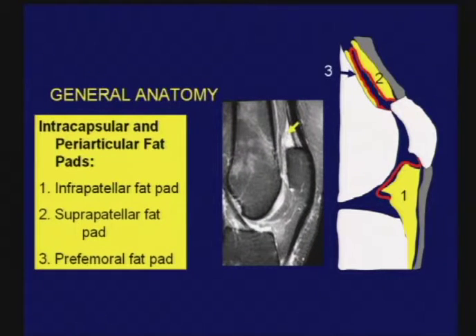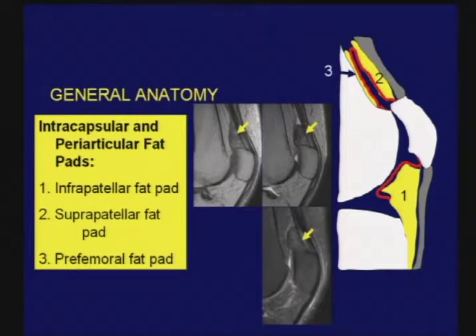The second location I show you is edema involving the suprapatellar fat pad. Here, this is associated with altered patellar tracking. It is associated also with quadriceps tendinosis and even partial tears of the quadriceps. And so it is an observation that you should report on when you view the imaging study. Sometimes it's not so much edema, but enlargement and fibrosis as shown in this particular example, but I think the importance of the observation remains the same.